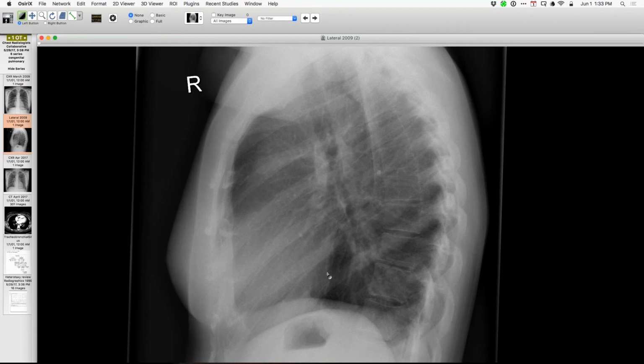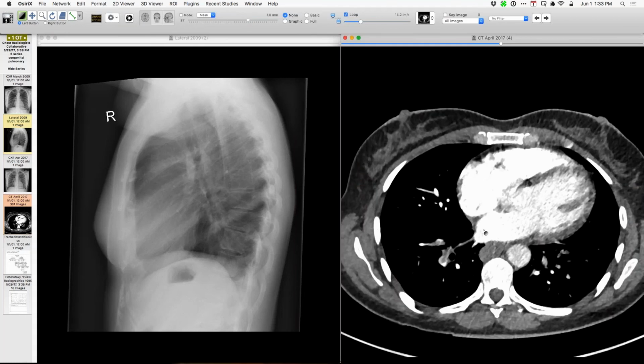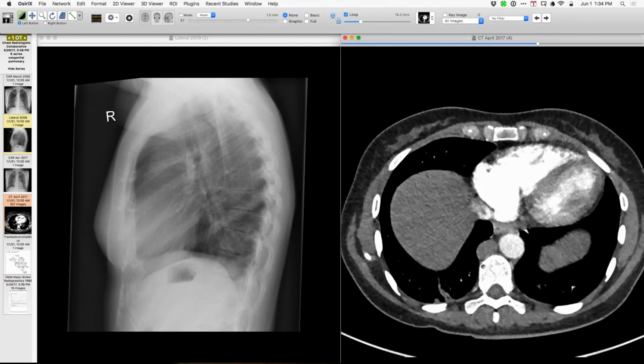So you can see that interface back there. People said, okay, if there's azygous continuation, we know that the inferior vena cava is absent, and therefore that shadow down there does not exist. And so they would show examples of that shadow. So you won't see it face on here. It still exists, but they said it doesn't exist because it can't, because we know the IVC is interrupted. So they would ignore the finding on lateral.